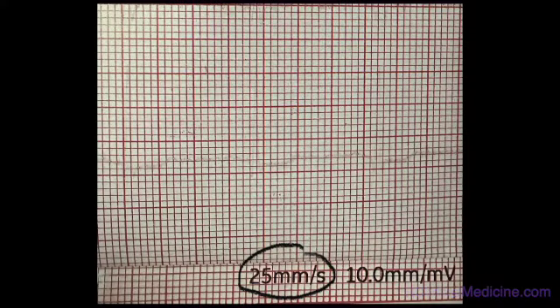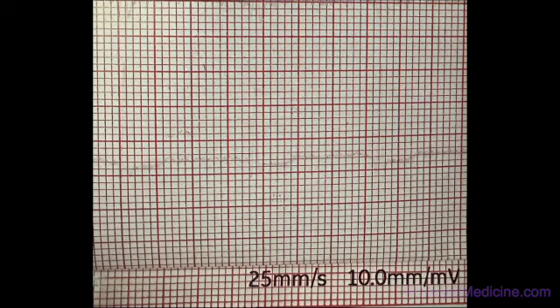The electrocardiogram paper runs at 25 millimeters per second as written here. The 5 large squares run in 1 second. If a beat falls 5 large squares apart, that means every second 1 beat, 60 beats per minute. Let us look at the issues with sinus node activities and resultant P waves. I am going to draw only the P waves and ignore the QRS complexes. Please imagine that the QRS complexes are following all the P waves.